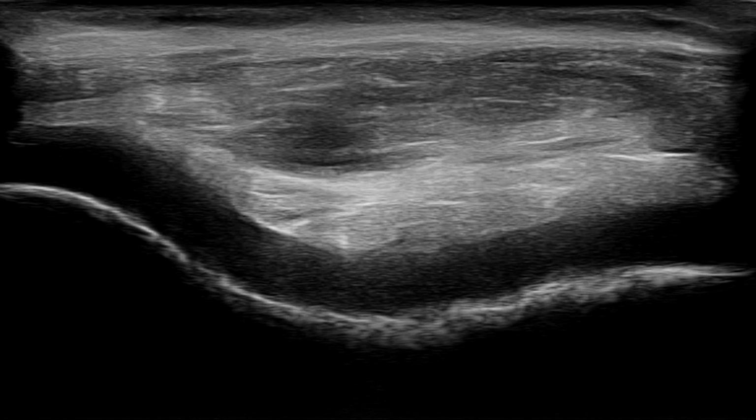This image demonstrates relatively thick cartilage at the level of the trochlear groove. Such an appearance is commonly observed in children or adolescents. In growing individuals, articular cartilage is naturally thicker but remains homogeneous and smooth.